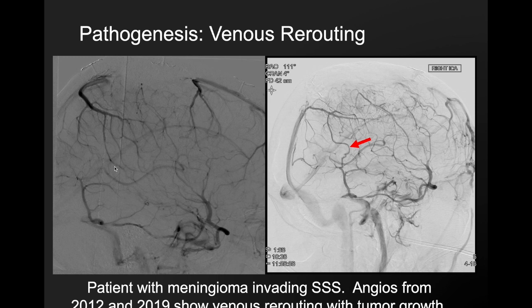For example, this vein here and this vein here are now connected by this mature venous collateral that developed on the surface of the brain right here. Also, you can see here this mature connection with the superficial middle cerebral vein that developed as a result of the fact that these cortical veins here could no longer drain into that superior sagittal sinus. So we do see remodeling of the veins even into adulthood. So it's conceivable that this could happen in embryonic life and also in early childhood in the veins of the brain parenchyma itself.